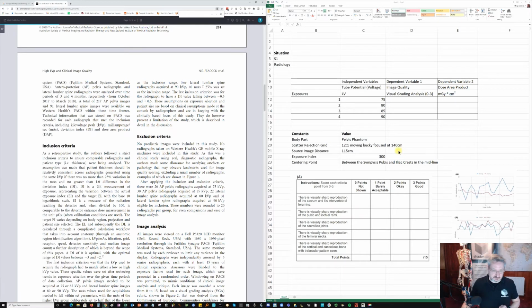So in a situation where you can't get the students into the campus to do this experiment individually, then this is something that I can do as an experiment via a screen sharing website, something like Zoom or Microsoft Teams or any of those voice over internet protocol video calling software. And then they could be engaged. We could get them to talk to me about it, and so on. So basically, let's just set up for the first exposure.